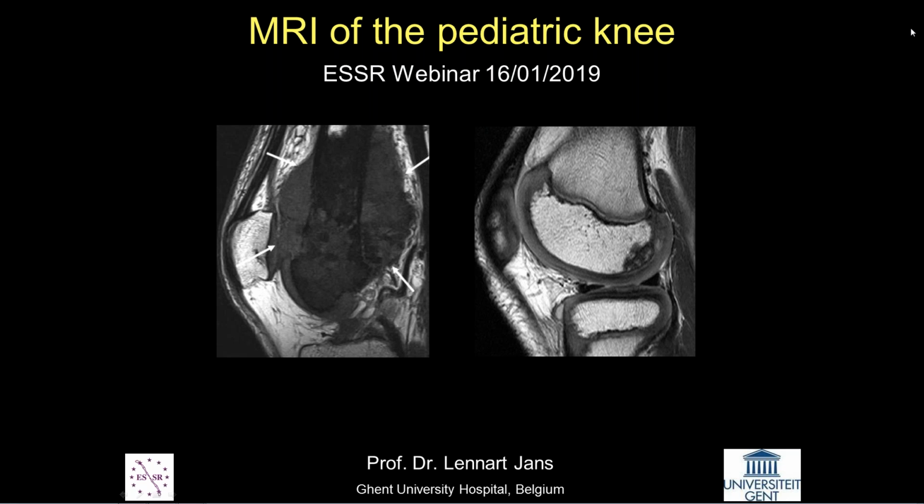The problem with these malignant tumors in children, soft tissue tumors in children, is that they look really nice and neat and well defined, well delineated on ultrasound. So we had more than a few cases where the final diagnosis differed from what was seen on ultrasound.